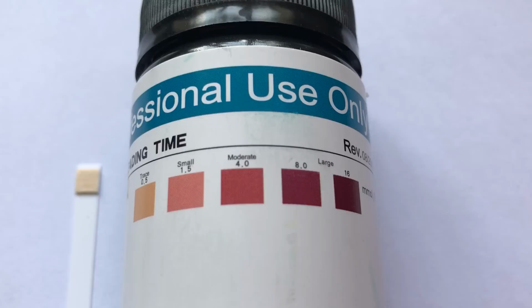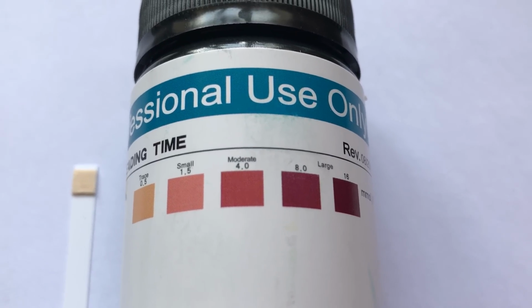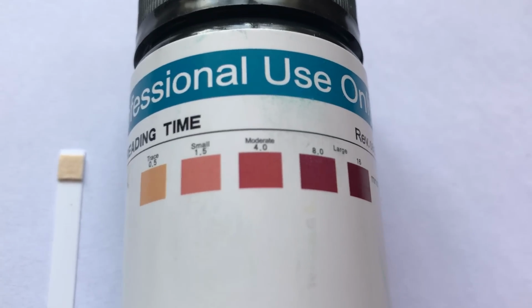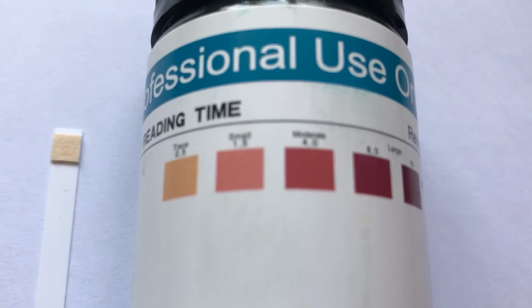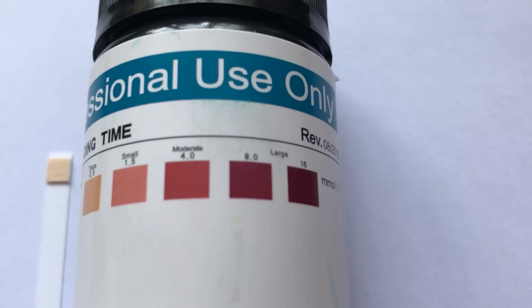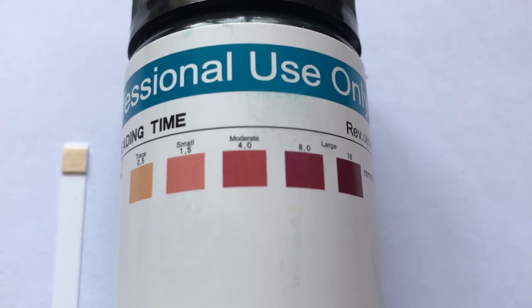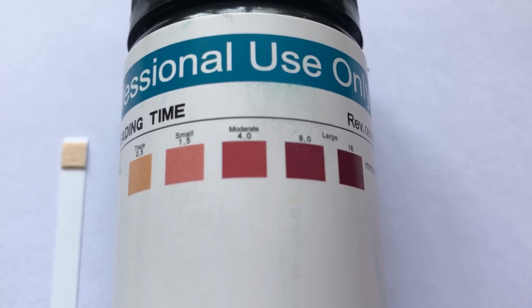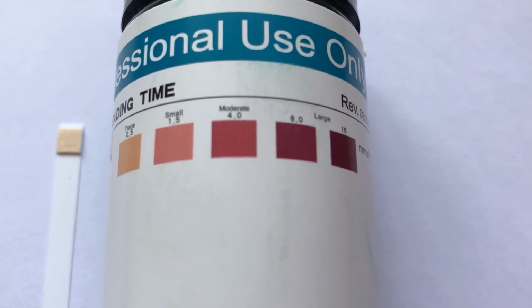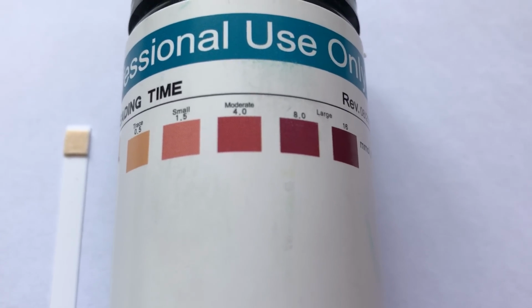Now, on the majority of urine ketone test strips, you will see guidance given in terms of the color density on the test strip once you've dipped it, and the guides tend to be signified as a trace, small, moderate or large amount of ketones. We're going to talk about what that means in terms of the levels, because depending on where you are in the world, you will have one of two scales for the ketones.